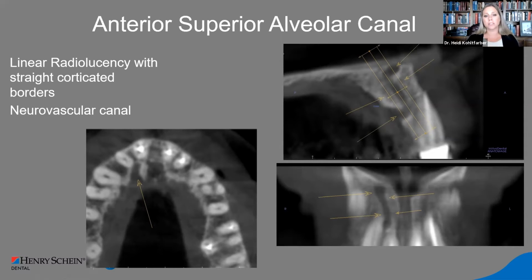Now, of course, in radiology, we see the good, the bad, and the ugly. We do have a very wide no judgment zone, but we have seen cases where small incisal type branches, whether in the maxilla or the mandible, can cause numbness if they're impinged upon. So definitely we want to avoid those neurovascular canals whenever possible.